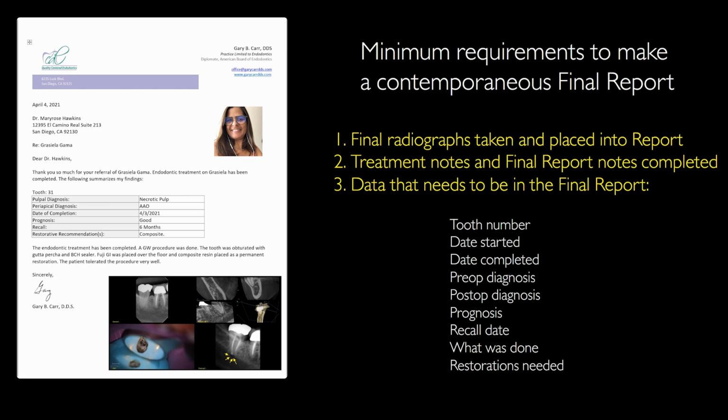When you consider what has to happen in a final report, you have to take the final radiograph. You have to do your treatment notes and final report notes. You have certain data that needs to go into the report: the tooth number, the date started and completed, the pre- and post-op diagnosis, the prognosis, the recall date, what was done, any restorations needed. So there's a lot of data that you need to fill out. I'd like to show you how easy this is to do in TDO.